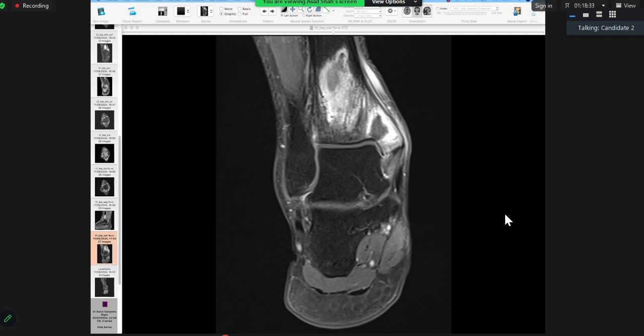I will inform the findings to the referring physician and also will refer this patient to the specific sarcoma MDT and for further decision of biopsy and further management. Also, I will ask for the chest radiograph if available, and also will ask for the previous imaging if available for comparison in this case. Okay, good. Yeah, they biopsied it and it came back as Ewing sarcoma.